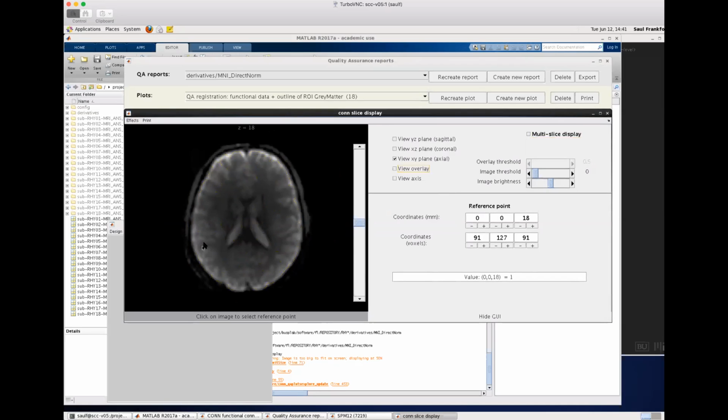Okay, so basically, this is the average BOLD signal across all of the time points in the brain, just one single slice. And black is basically 0 values, and these values are probably close to 100, or perhaps they are close to 1. Why are they close to 1? Oh, because we are looking at the mask, these values now. These are close to 100 basically, and so in these borders, in these regions, there are huge gradients of the average BOLD signal.